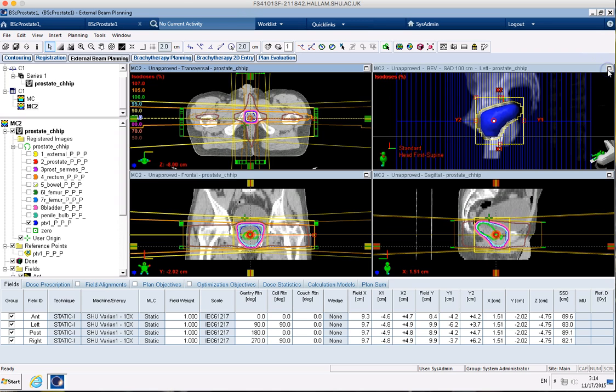But if you're unsure, what we can do to check is this grey line here shows exactly where we are in that view as well. So we can see that I'm on that plane there, and I'm right at the inferior end. And this is, as I've probably mentioned to you before, probably one of the trickiest things to do, to sort out in our head where we are in the patient, is trying to think in 3D.